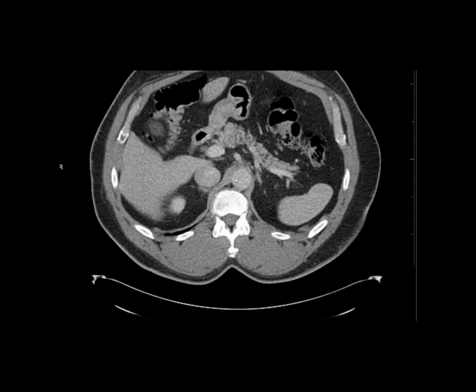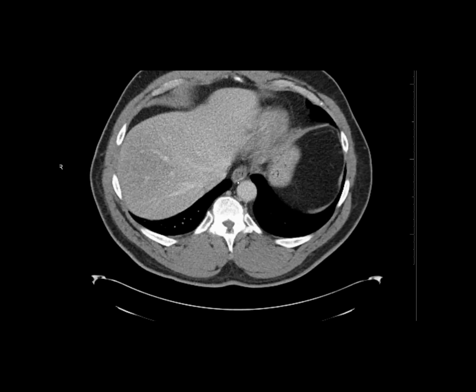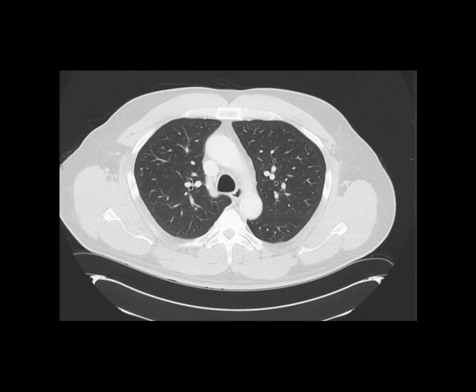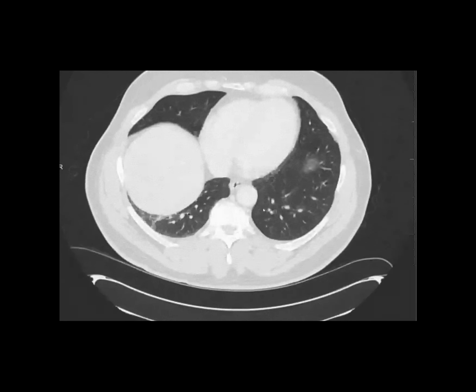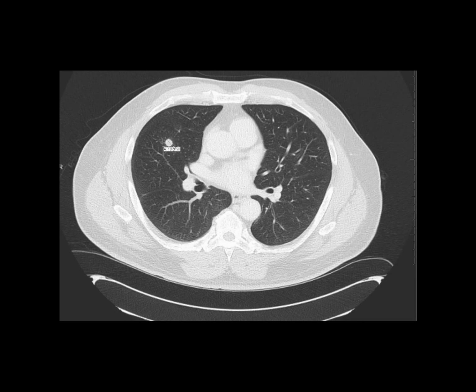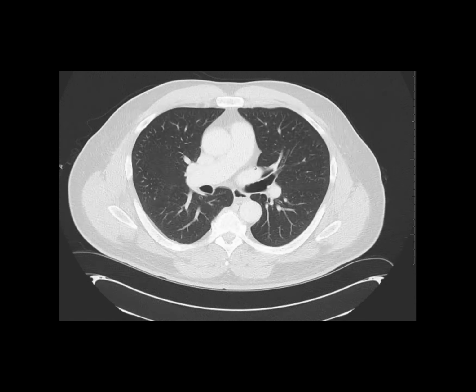bone only without regional lymph nodes has a higher likelihood of hitting the lungs and the liver. As I do a quick run through the lungs, you'll see that there's a node there, a node there, and that one is actually spiculated. So that's highly concerning, probably a fissure lymph node. Assuming that these are new, I absolutely presume that one is malignant. And this other one here would be highly concerning for thoracic disease.